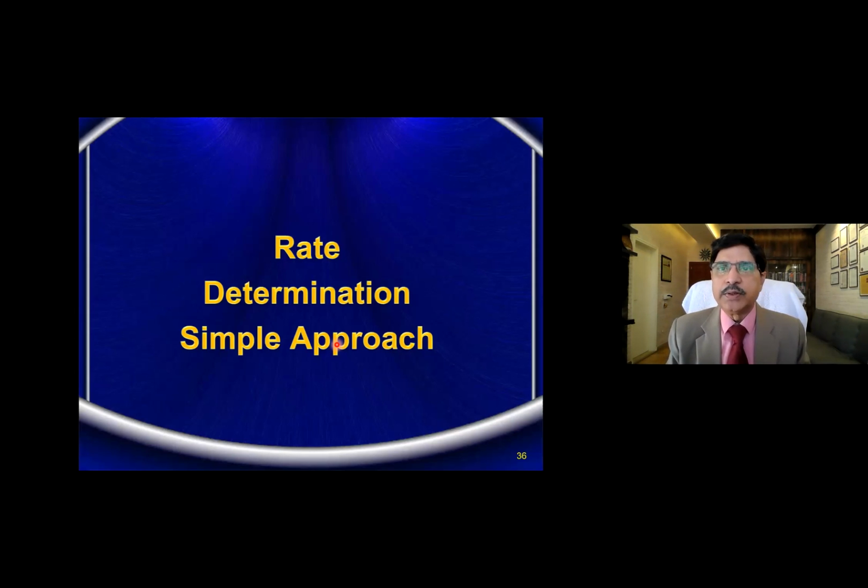So what did we do in this class? We have done the ECG paper identification. We thank our forefathers who gave us the ECG, and then we went into the paper identification, the x-axis, the y-axis, and the wave patterns P, Q, R, S, T, what each wave means, what the intervals are, and what the duration of each of them is normally. And also we correlated the different waves P, Q, R, S, T with the cardiac cycle.